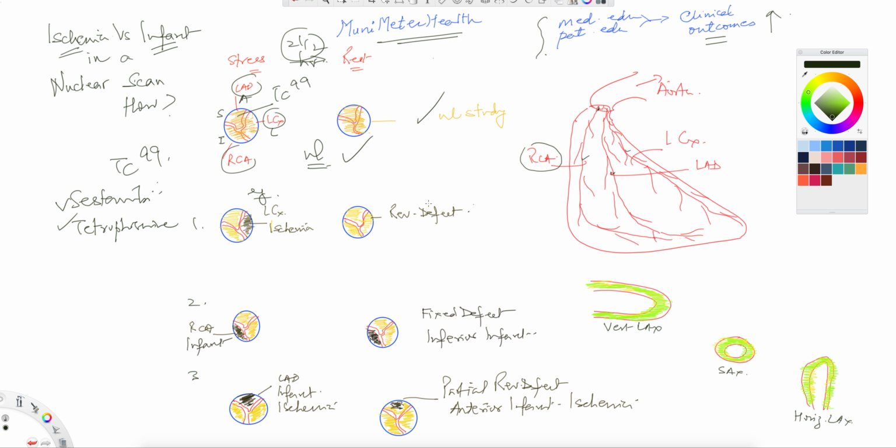It's going all the way to the apex. Remember, the apex is at the center. This becomes the apex, and this becomes the base. So when you look at the heart, obviously this is your apex and this is your base. This is your apex here, and this is your base. And this is your apex here in this view, and this is your base. Again, it's a short video we're doing, but we're trying to give you a great conceptualization of how it works in a 3-dimensional area. Okay, so the apex of the heart is here, and this is your base. So in different views, this is how the heart will look.